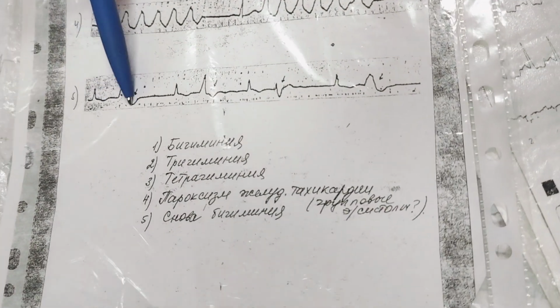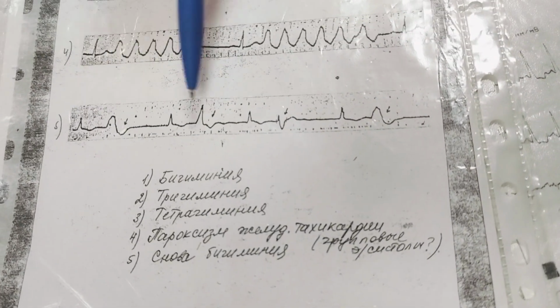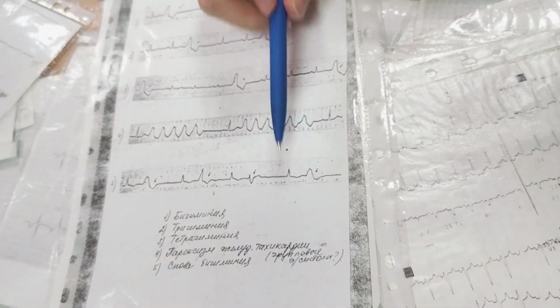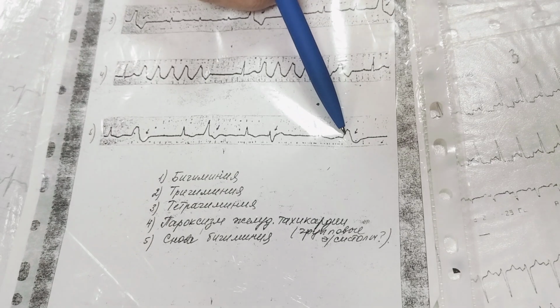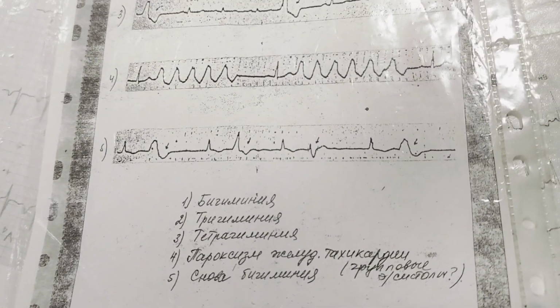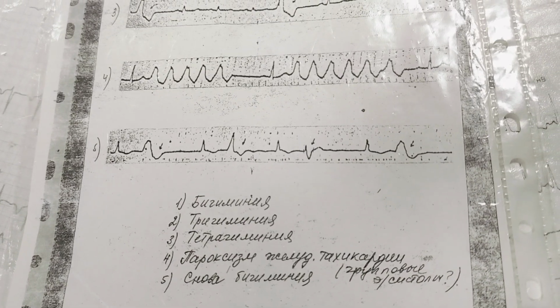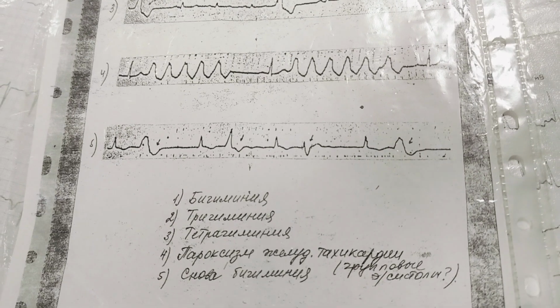In this case, every second contraction is an extrasystole, so it is bigeminy. All extrasystoles have an abnormal shape, so they are ventricular extrasystoles, but different extrasystoles look different in one lead. It is polytopic extrasystole. Different cardiomyocytes generate new extrasystoles, so there are many different places for extrasystoles.